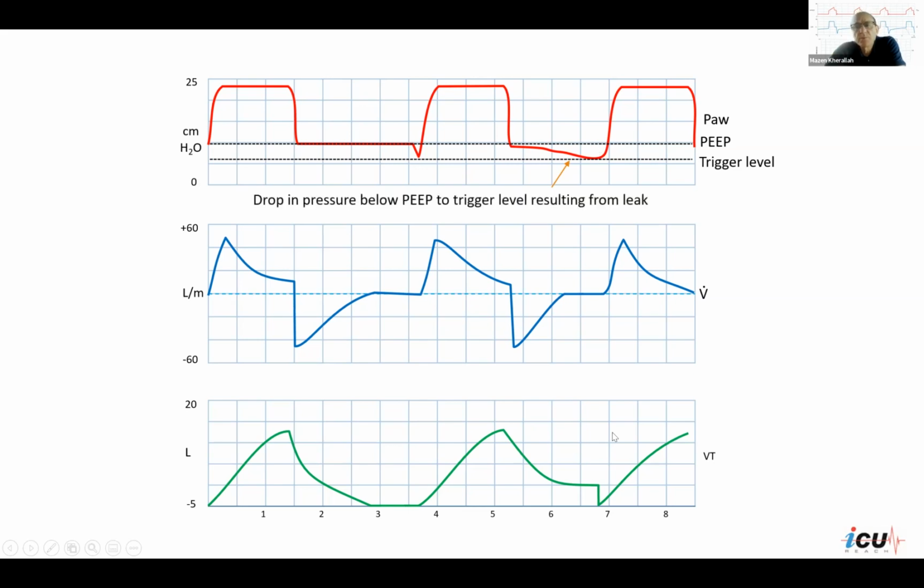You can also see that the inhaled volume, this is inspiratory volume, this is the exhaled volume. It did not go down to the 0 level till before the next breath. So you can see this is what the machine gave. However, part of this leaked. If the balloon, for example, is not inflated well, there's some air is going to leak. And then during expiration, well, the machine exhaled everything and then stopped at this level.